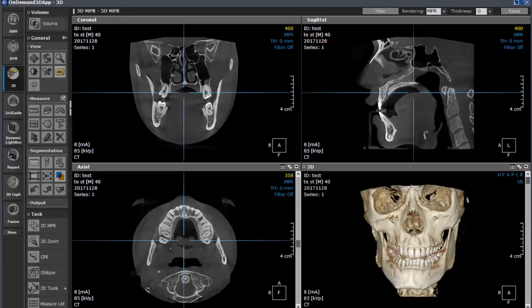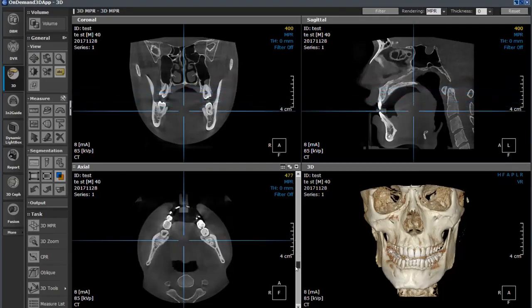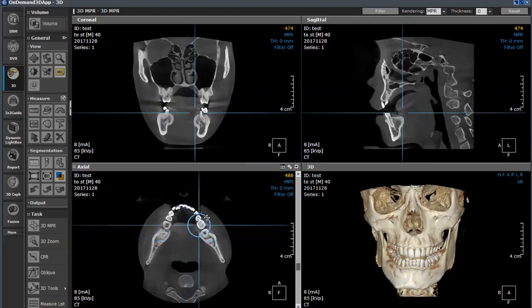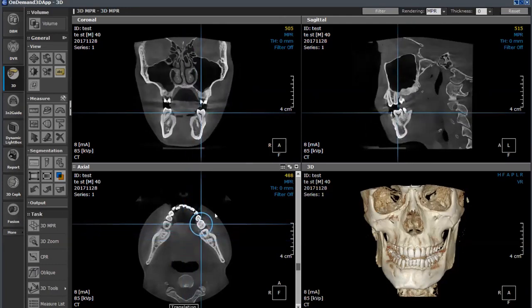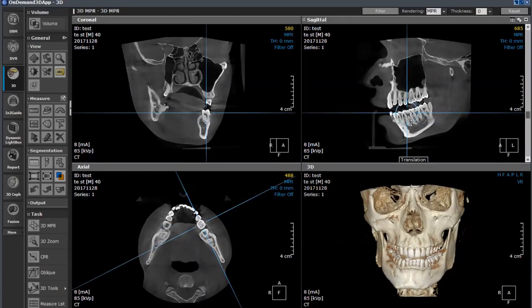There we go. With that in mind, we can start making a general evaluation of the patient themselves. Let's go down to the mandible, and we can start moving our circle over to the left side and then tilt it so we can create that tangential view that basically spreads it out to where we can see essentially a buccolingual view in the top right-hand corner in the sagittal.